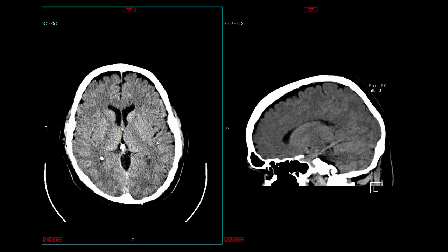A clinical correlation here is that a lesion in the left posterior superior temporal gyrus, this is Wernicke's area, and that will produce unintelligible content, though you will have normal syntax and normal rhythm of language. So you want to be cognizant of the posterior portion of the superior temporal gyrus on the left is generally considered Wernicke's area.